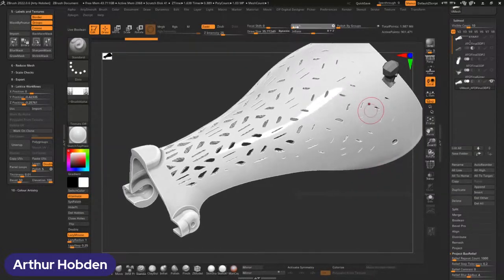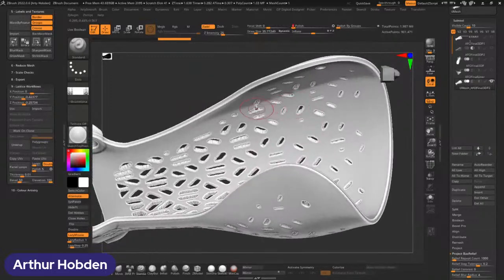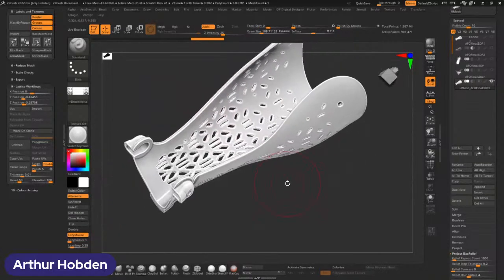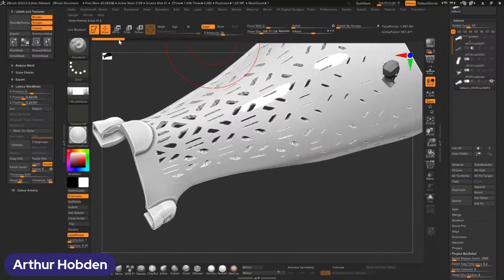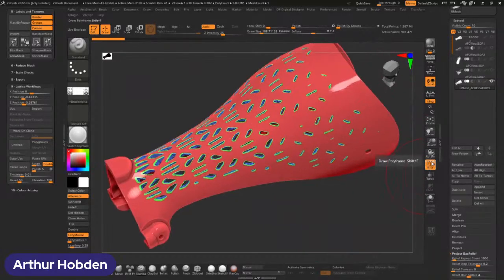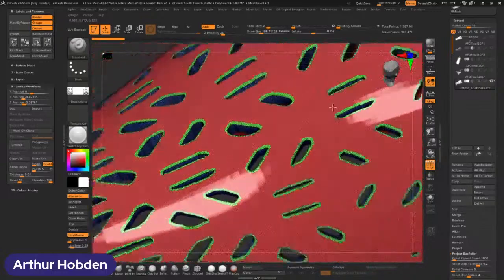So, we can polish this, clean up those edges a bit, especially now that we are in a mesh modeler, we can actually smooth out a lot of these corners that in CAD would have been very difficult to do. But you start to look a little muddy if you're not careful. So we've got to be careful with that. If we look at our fill, again, we're keeping our groups. We still have lots of good geometry for coloring.